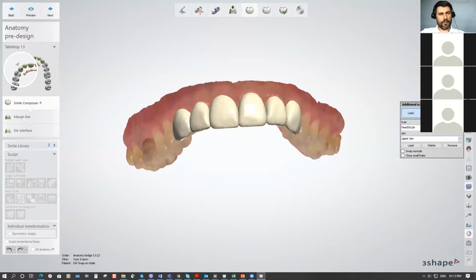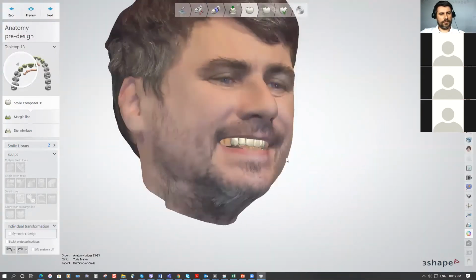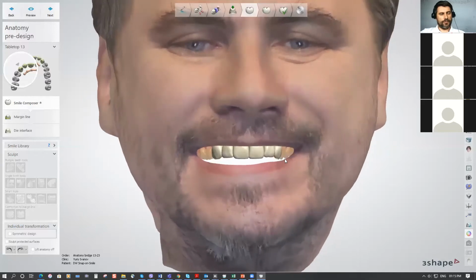I do have them uploaded, and it will look like this. I have my face scan and my surface scans or jaw scans and design over my face.